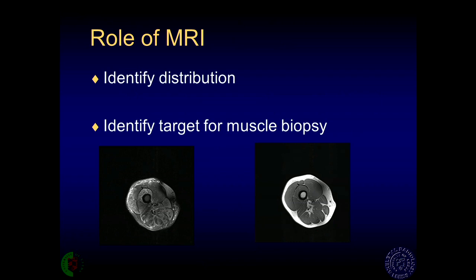This is a typical appearance of an acute polymyositis. You can see this patient has quite gross abnormality in the muscle here of his right thigh. This is normal. This medial vastus medialis is pretty normal, bit of edema here, but all the other muscles are showing diffuse muscle edema. And it's just like a little bit of greying out of the muscle. A little bit of fascial involvement, but not too much, and no fat atrophy on the T1 weighted scans.